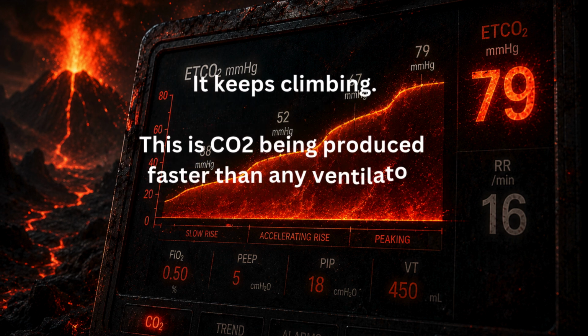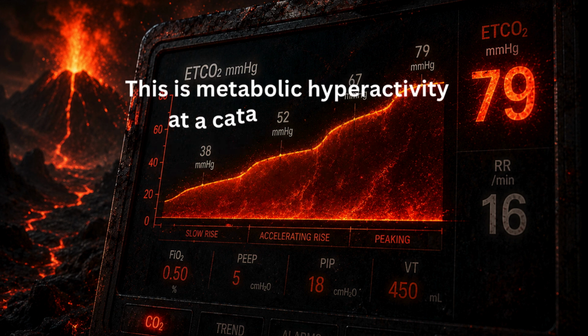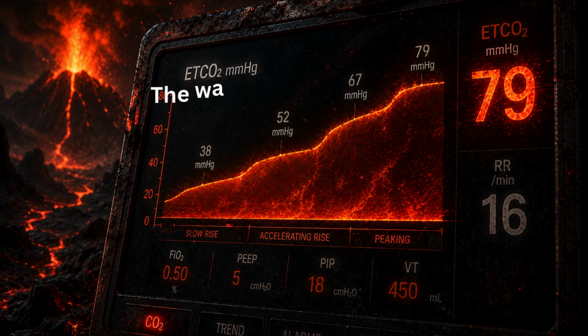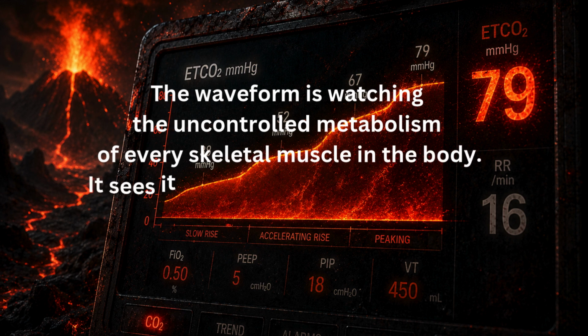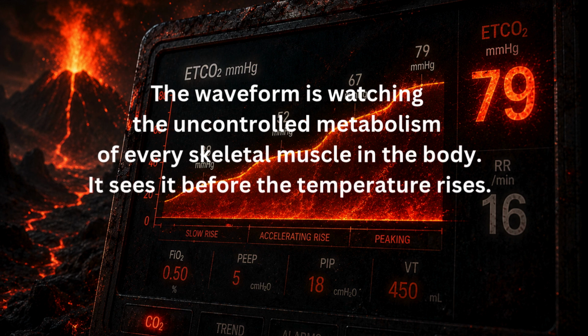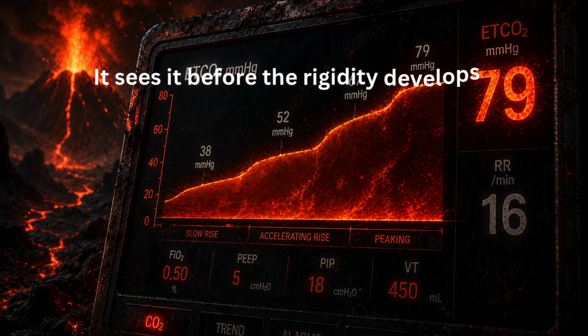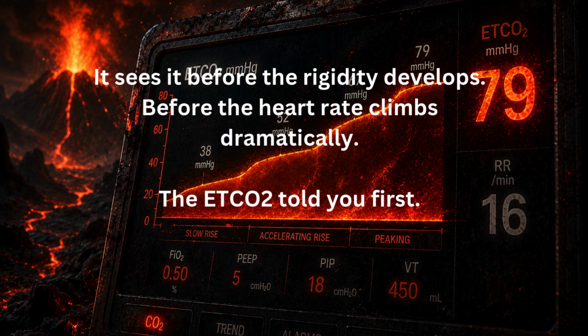This is CO2 being produced faster than any ventilator can eliminate it. This is metabolic hyperactivity at a catastrophic scale. This is malignant hyperthermia. The waveform is watching the uncontrolled metabolism of every skeletal muscle in the body. It sees it before the temperature rises. It sees it before the rigidity develops, before the heart rate climbs dramatically. The ETCO₂ told you first.